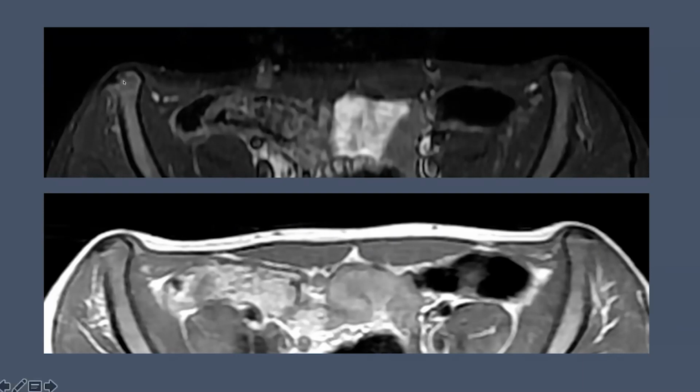There is some haziness in the region here, maybe some displacement of the apophysis here, but there is no marrow edema. And if you see the MRI at first look, it might almost appear normal if you don't know the exact site of the patient's symptoms.